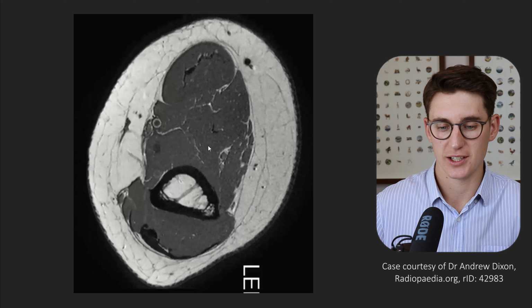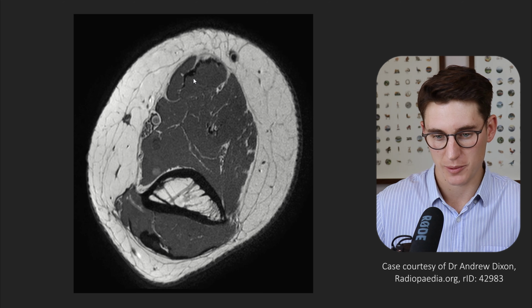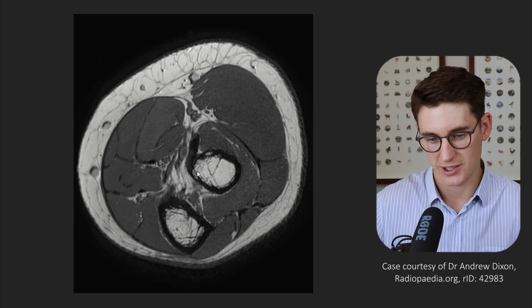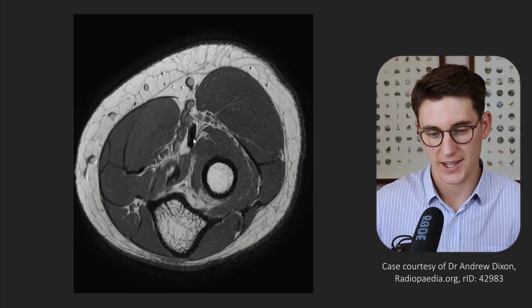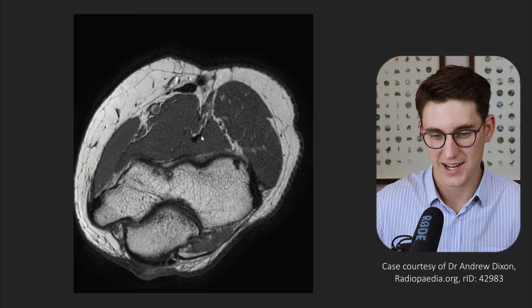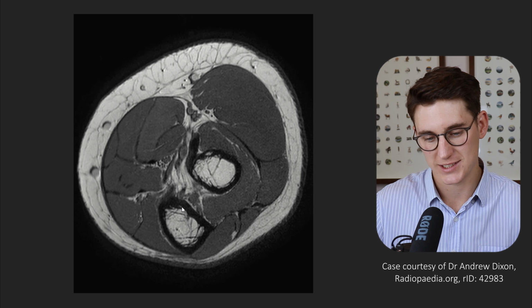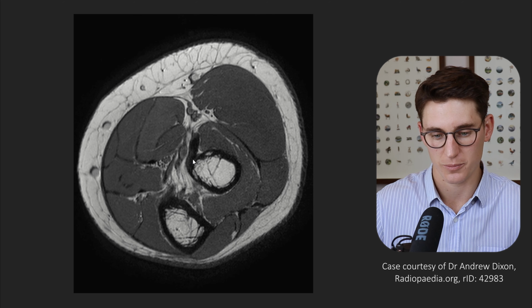Let's go up into the brachial portion of the upper limb and start at our biceps brachii here. We should be able to follow this tendon down, and that will insert into our radial tuberosity. Follow it down. There is our radial tuberosity lying on the medial surface of the radius. Again, if we follow that up, we should be able to look at our brachialis muscle and the brachialis tendon that heads down into our ulnar tuberosity. We can see it inserting there onto the ulnar tuberosity. You can see how the ulnar tuberosity is more anterior. Our radial tuberosity is more medial here.